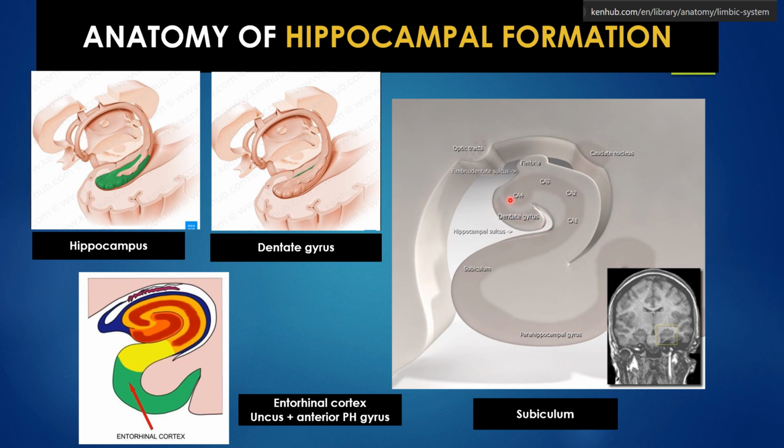Then as you go from medial to lateral, this is basically the brainstem. From medial to lateral, the numbering is actually the opposite, 4, 3, 2, 1. It is in the reverse manner. So that is the hippocampus. It is labeled CA because we already saw it can also be called cornu ammonis. So CA 4, 3, 2, 1.